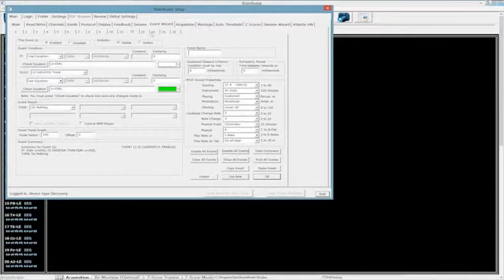And this is actually a special event that we have in right now. It has to be modified a little bit better, and it was the original implementation of it. There's going to be a better implementation out because I know some people over at Zukor that have made this work really excellent with 2 bands or 1 band or 3 bands, and that's why I jumped to this event 12 right here.